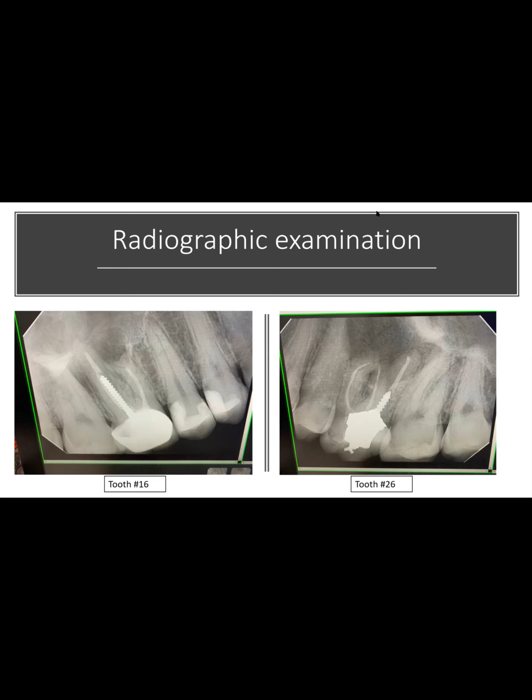Okay, on the 1.6, I see a radiolucent area around the mesiobuccal root. I could see radiolucency also between the, which I think is from the distal root, but it's between the 7 and 6. You could see some radiolucency there as well. Right. Is it uniform?